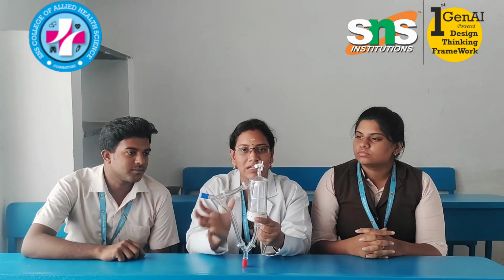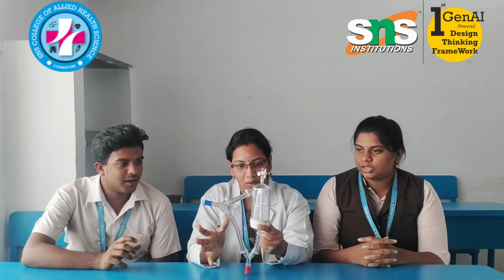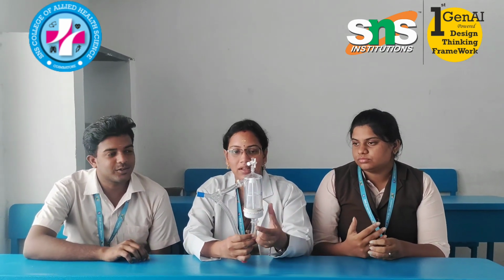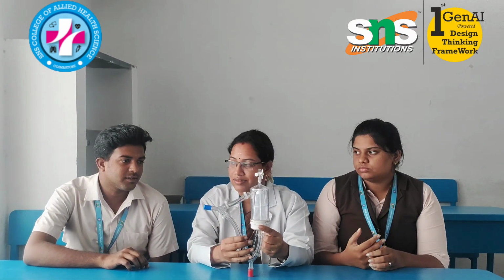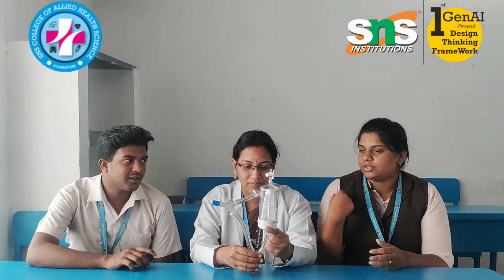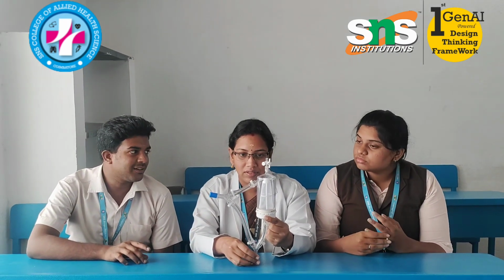Some circuits nowadays come integrated. Integrated means the bubble trap is already present inside the oxygenator and does not come separately. What is the main advantage of connecting this? It removes the microair before it enters the patient.